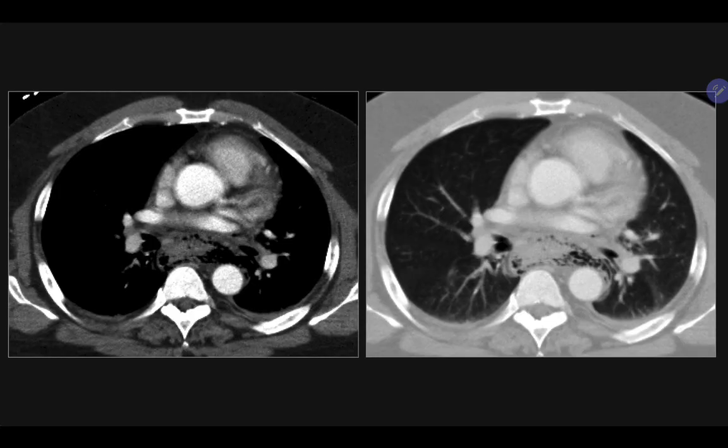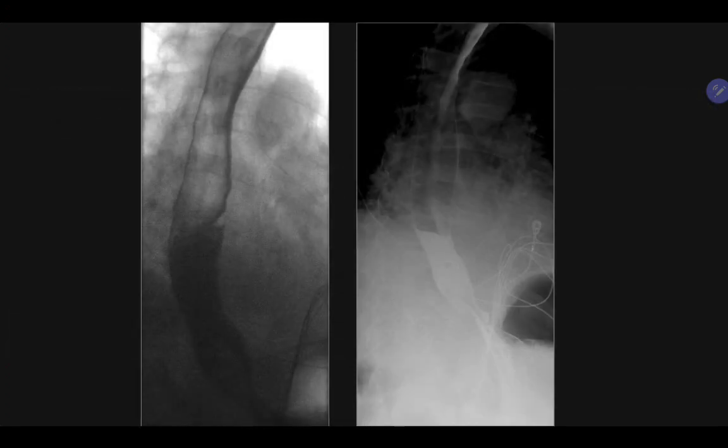This patient presented urgently to the emergency department with a thickened hemorrhagic esophageal wall and pneumomediastinum. Clearly, there is a leak, and cardiothoracic surgery wanted us to do an esophagram to find it. But for the life of me, I could not find it in the fluoroscopy suite. I had the patient drink repeatedly, but could not locate the injury.